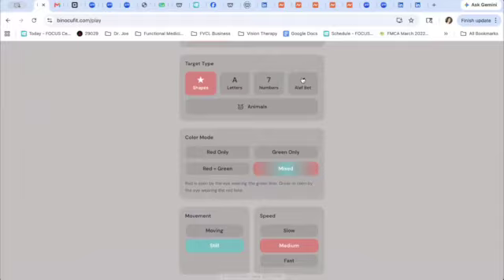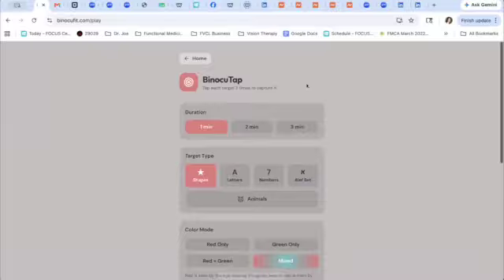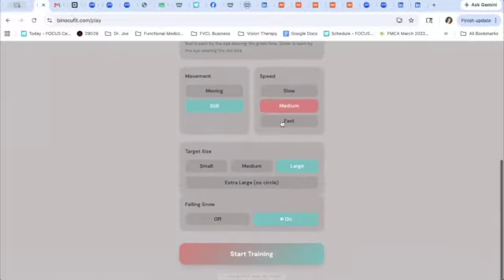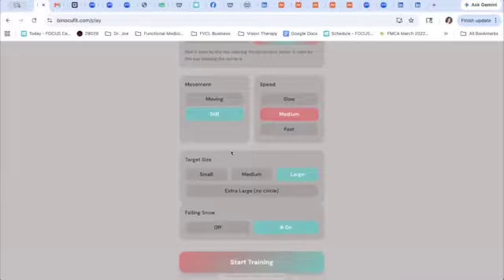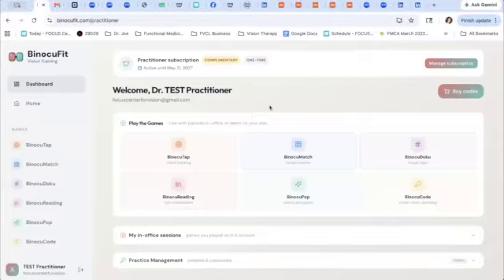Animals, I have Hebrew letters in here. I could really add anything if anybody had any ideas that they wanted me to put in there for symbols. All right, so let's get back to the home thing.